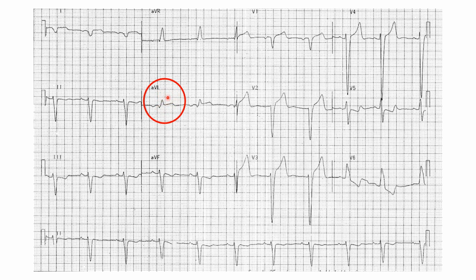And it's important to mention that in this patient's previous ECG, there was some left bundle branch block. So this is suggestive of a high lateral infarction, so a high lateral MI. So I hope that makes a bit more sense.